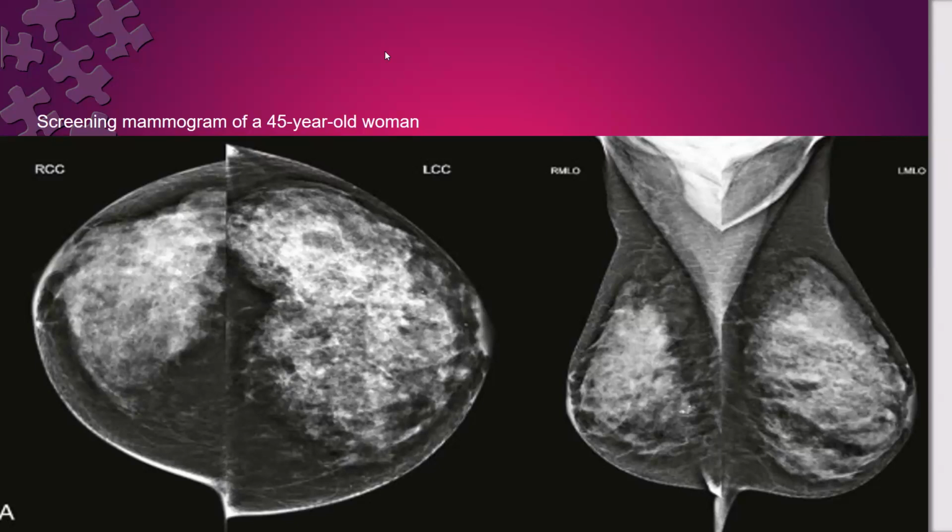One breast is smaller than the other with a global asymmetry of glandular tissue. What do you think? Which one is abnormal? Or do you think it is normal? There is one small, and there is no definitive focal lesion seen. No calcification, no skin thickening, no retraction.